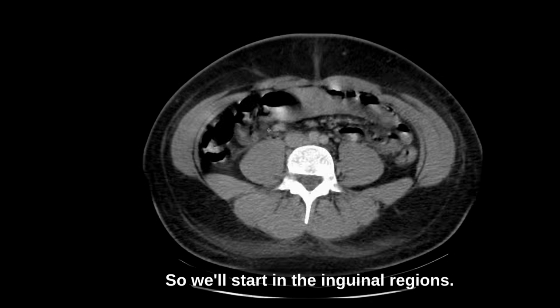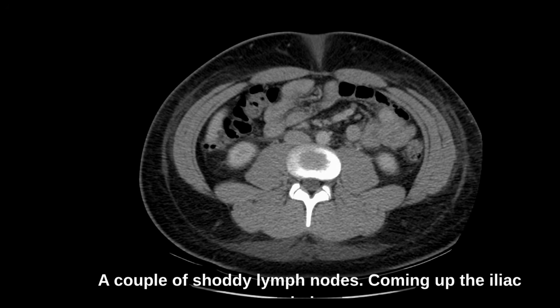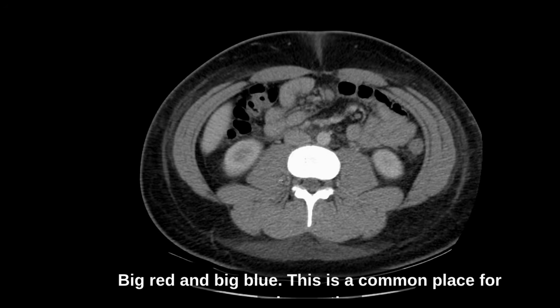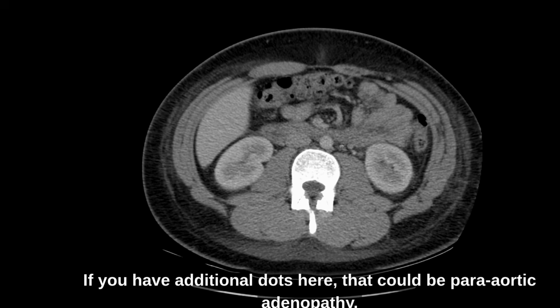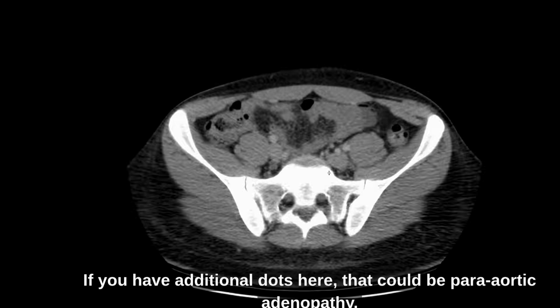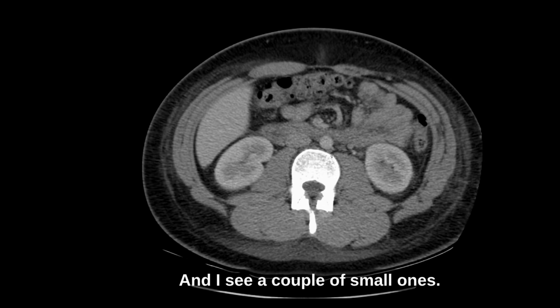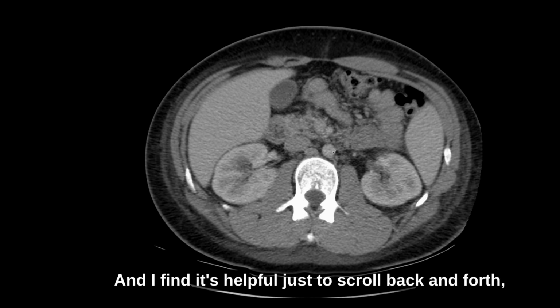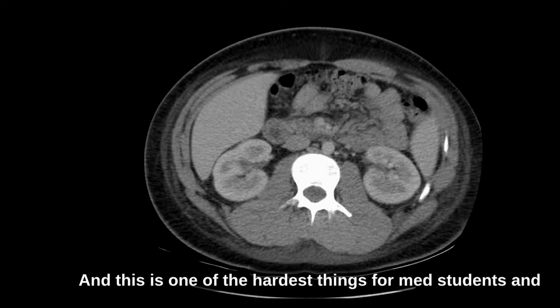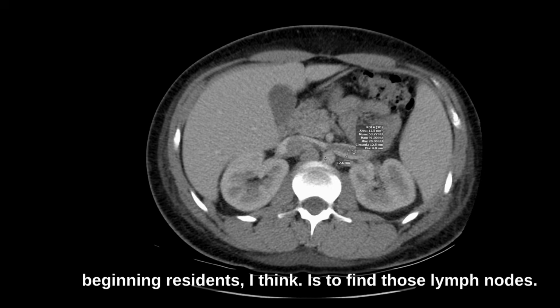So we'll start in the inguinal regions, a couple of shotty lymph nodes coming up the iliac chains. And then we should only have two dots coming up, big red and big blue. This is a common place for adenopathy. If you have additional dots here, that could be para-aortic adenopathy. And I see a couple of small ones, and I find it's helpful just to scroll back and forth, looking for those lymph nodes. This is one of the hardest things for med students and beginning residents, I think, is to find those lymph nodes.